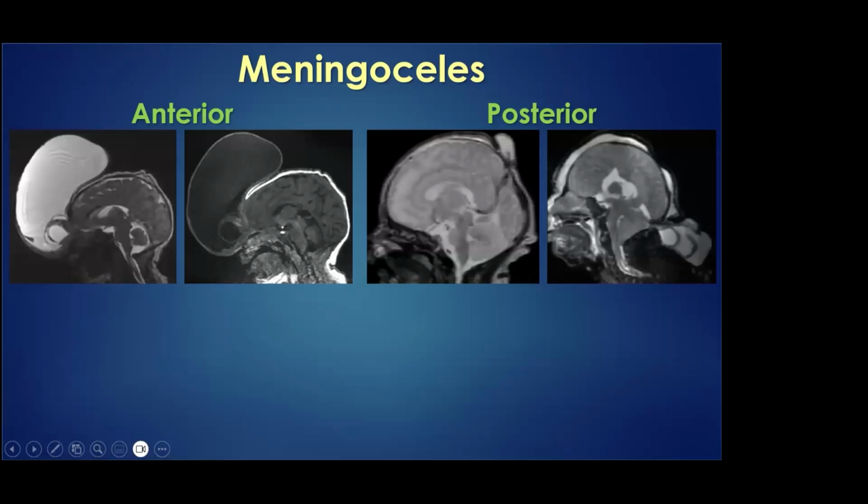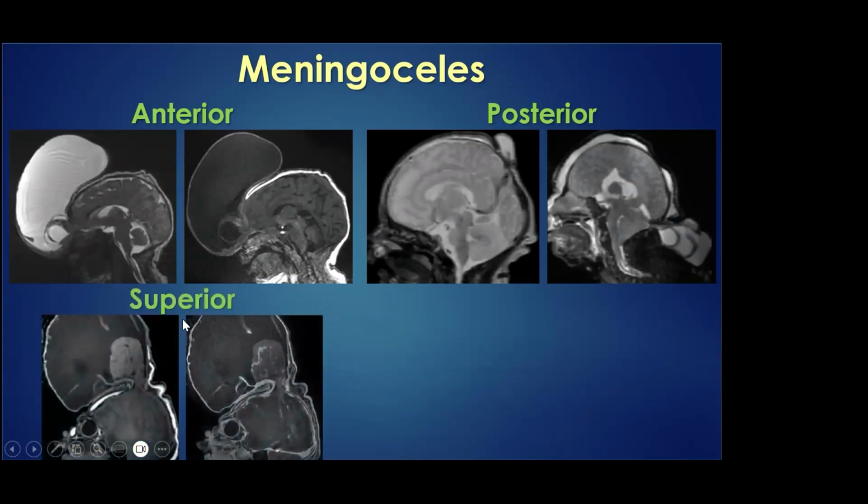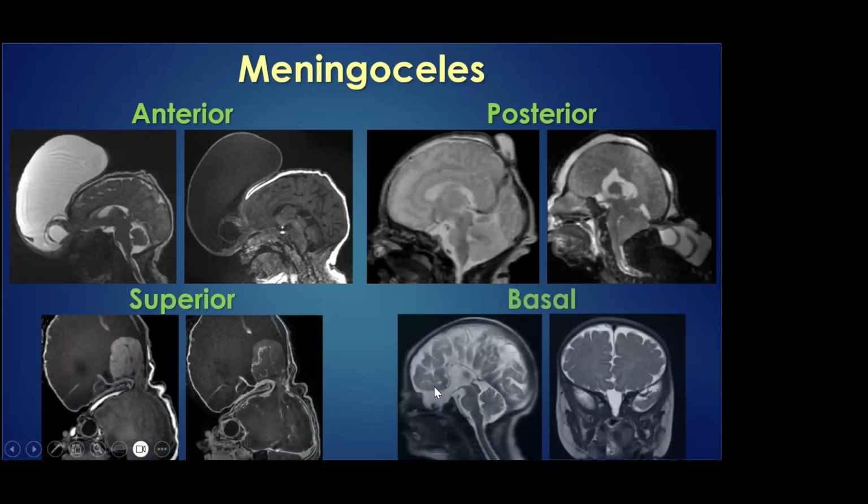And occipital ones, this is actually a Chiari 3, right? So you have a cervical occipital encephalocele. You also have some interhemispheric holoprosencephaly. Superior vertex ones are pretty rare. You can sometimes see that with amniotic band syndrome. And then basal encephalocele, so the sphenoid ones, those are the frontonasal dysplasias or morning glory syndrome. So they can have excavated optic discs, cleft palate, duplicated odontoid and pituitary, oral teratomas, hypertelorism, and so forth. So a whole kind of facial mid-face fusion syndrome.